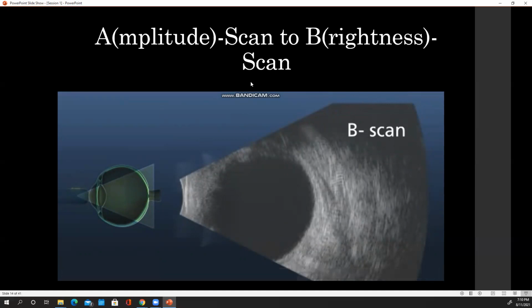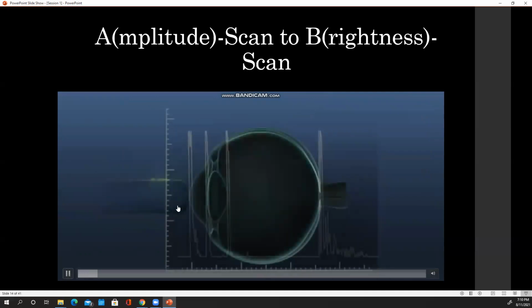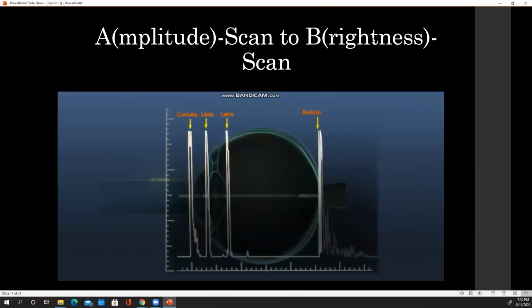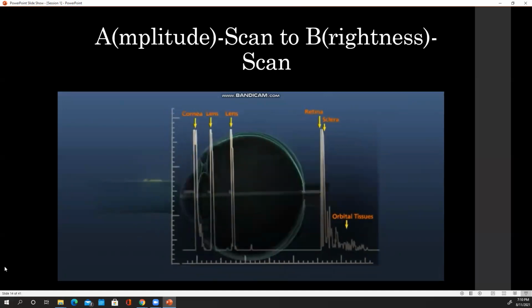Does that make sense? I'm going to do this again. Okay. So we're going to watch it again. And this is how you hit play. So 70,000 of these are happening a second. So in every direction, in 1 second, it's like 70,000 of these are happening, but it's going to make 216 of these A scans from up all the way down to here to create one of these B scans. Here's the A scan. There's your A scan. So we're saying, okay, that's the representative A scan.